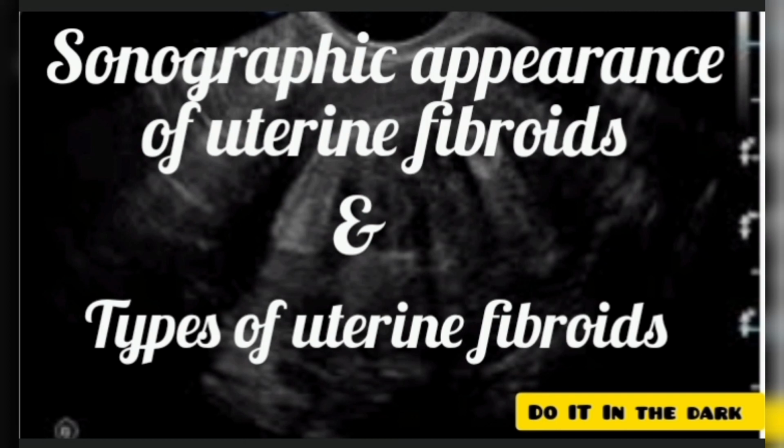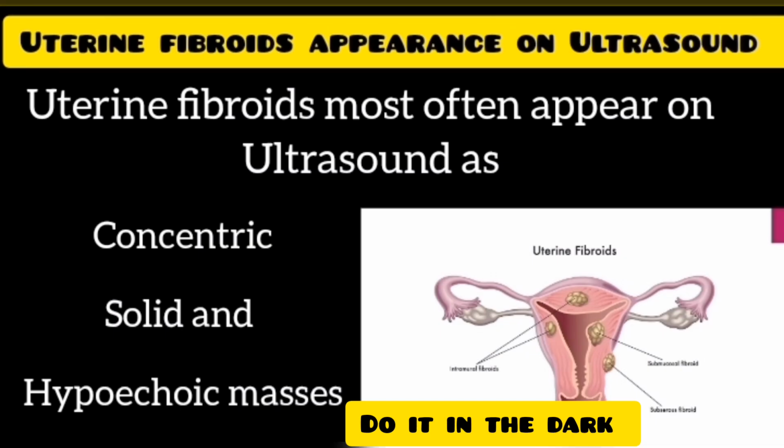In my last video, we discussed the basics of uterine fibroids. Now, in this video, we will discuss the sonographic appearance of uterine fibroids. Let's start the video. How does uterine fibroid look like on ultrasound?